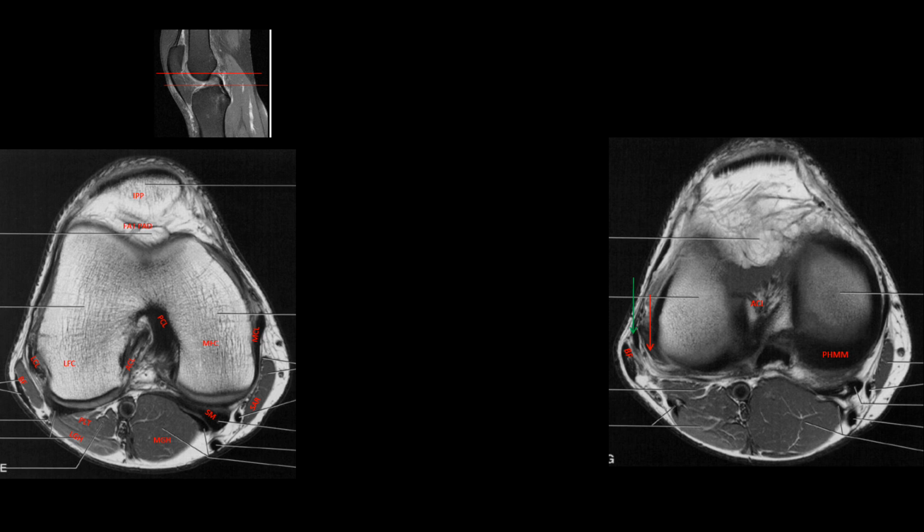And then as we get further down into the fat pad here, you see the tendon, fat pad. You see your collateral ligaments and part of your calf muscles here. So be able to look at those. You can see your ACL in the middle there. Be able to look at these in a cross-sectional way to review this for your anatomy as we look at pathology in the knee on the MRI and the clinical cases during lecture.